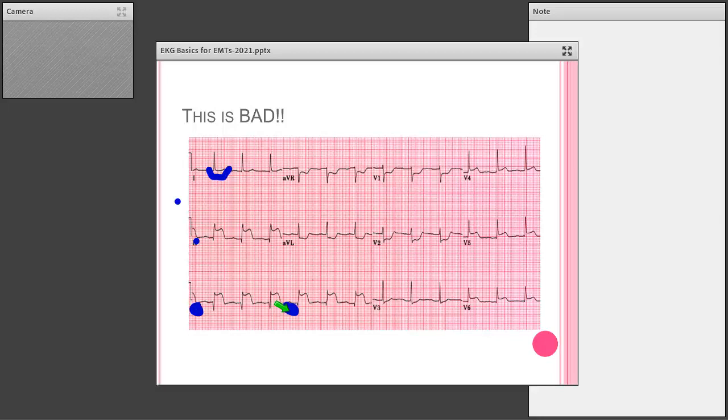They go together. They're all looking at the inferior part of the heart. We can see here we have this isoelectric line, right? And clearly we've got a whole crap ton of ST elevation in all 3 leads: ST elevation in 2, ST elevation in 3, and ST elevation in AVF.